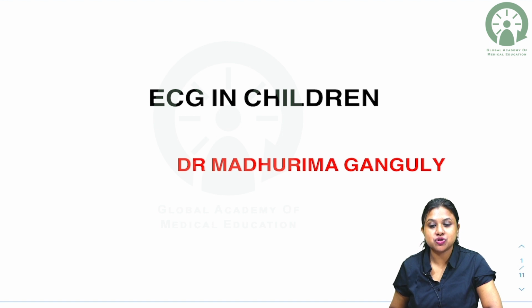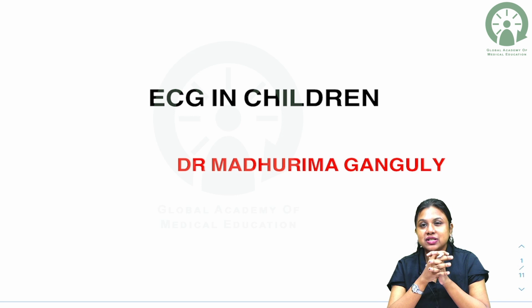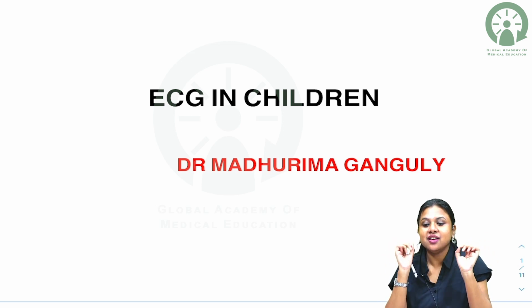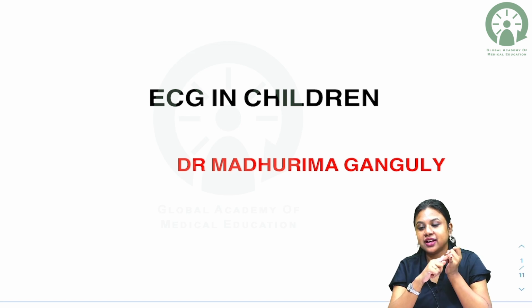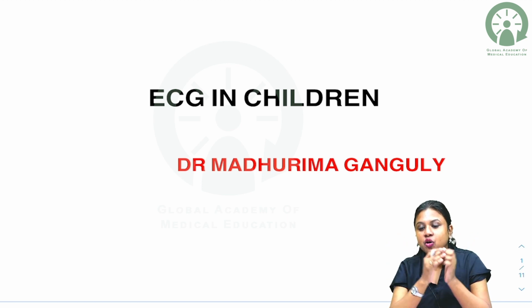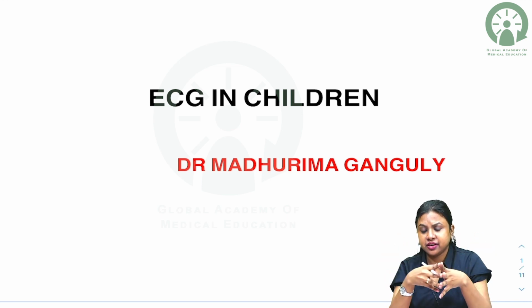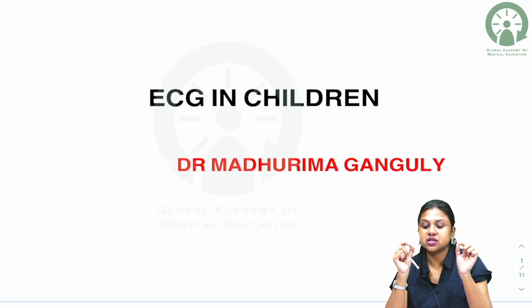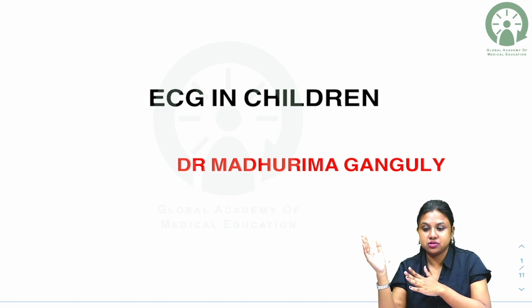We'll talk about ECG in children. In case of ECG in children, we'll just see 3 or 4 ECGs very specific of either any syndrome or any specific arrhythmia we are talking about. We'll not be covering bradycardia or bradyarrhythmias or all the tachyarrhythmias. We'll just see one tachyarrhythmia and we'll see one cause of myocardial ischemia in children and 2 syndromes and what can be the specific ECG in those disorders, right?